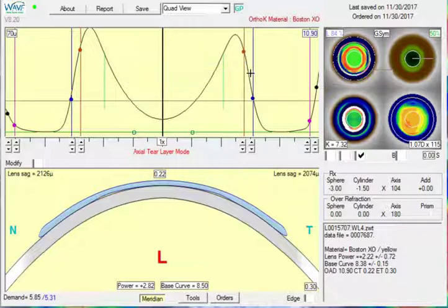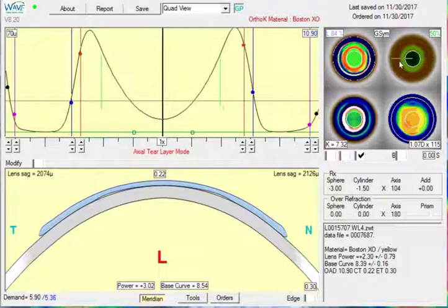Changing the dimensions of the OZ and IC did change the topodemand already in the lens, so we just need to bump it a little bit more. We'll still do this in 50% mode. So we're about 3.1, and then we'll do the same thing in this meridian.